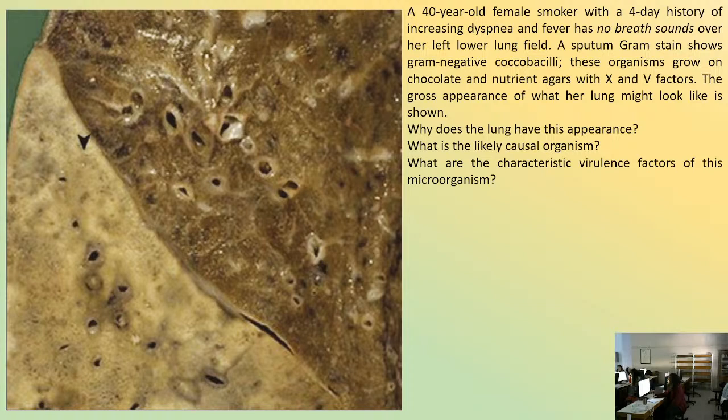That means the inflammation would fill the wall of the bronchi and the surrounding alveoli. That would be bronchopneumonia. This is not the case. Here we have the inflammatory infiltrate within the alveoli, and a whole lobe of the lung has been influenced by this process.